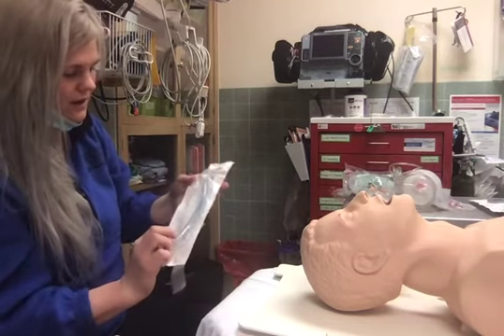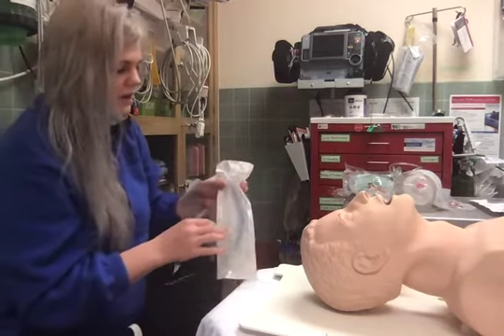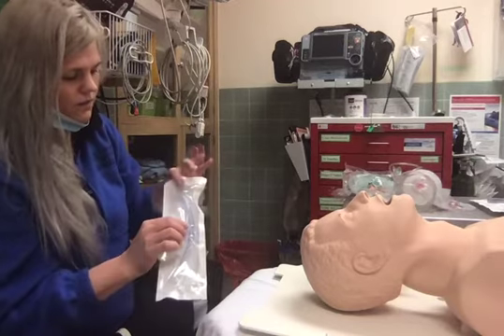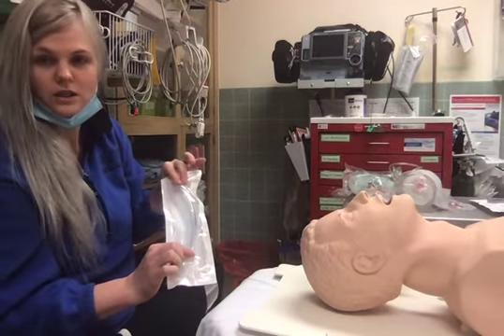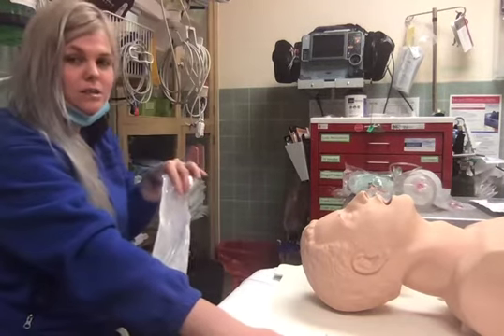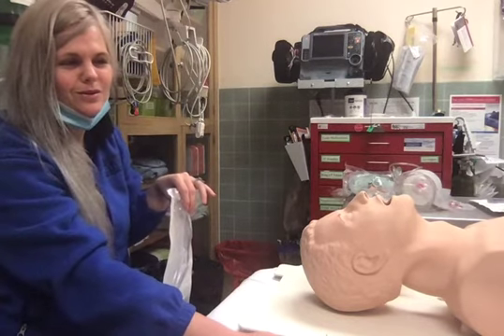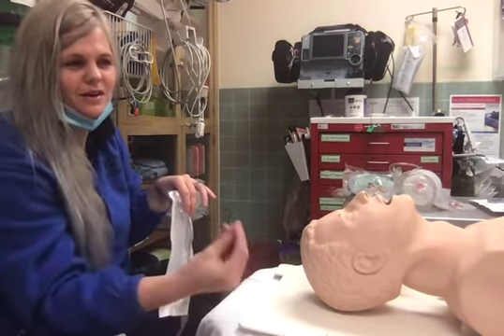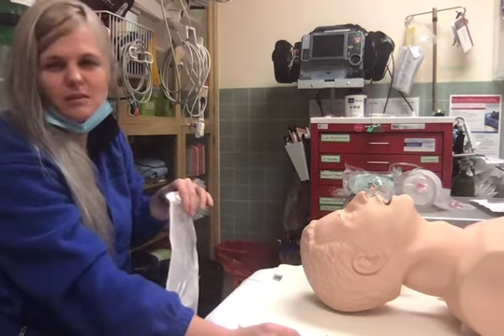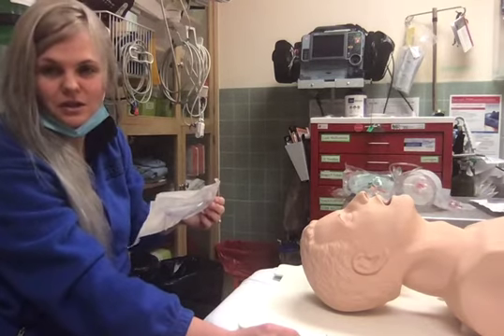So for this, just for the sake of presentation, I'll be more describing the NPAs. This is an NPA. This is our largest, at a size 34. This is utilized for patients that you're not able to use your OPA on. So awake patients, but I shouldn't say awake. Patients that are able to control their airway to a certain extent, that they are able to maintain their gag reflex, but yet they're still not able to maybe follow commands. One place that people like to utilize these is when you have an intoxicated patient.